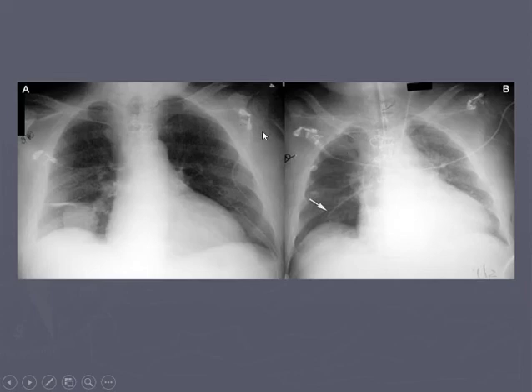Okay, here's an interesting one. So, same patient. You can see this area right here. If I remember, hold on, I got it. Looking for my lines. Okay, I'm sorry. Again, I haven't seen these films in a few years.